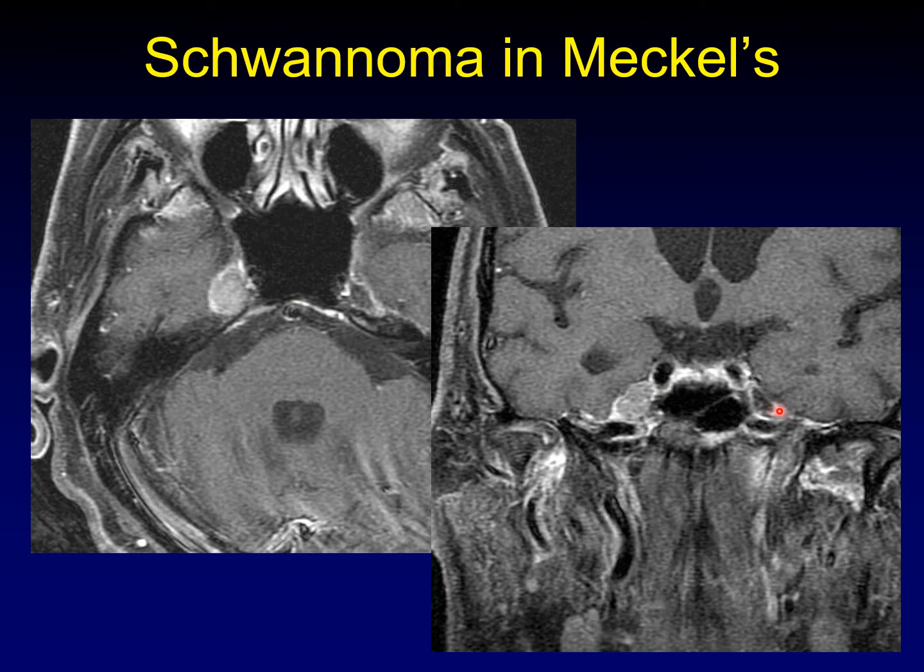Same thing in coronal. You can see the normal Meckel's cave on this side filled with CSF, and here is the enhancing tumor on the affected side.